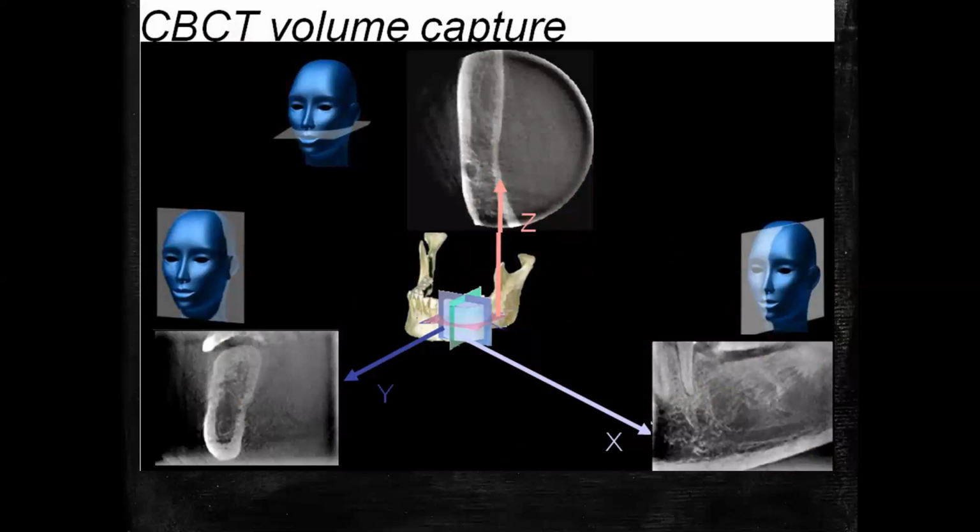Like it is very nicely seen over here. The topmost is an axial view. You can see the buccal side, you can see the lingual side, you can see the mental foramen. Now this view is the best view to assess the canals. Imagine a tooth being assessed from the top. It can show all the foramens and can also show the canals which are present. In case I want to see the buccal and the lingual cortical plate around my implants, I will go for an axial view. I will view the axial section.